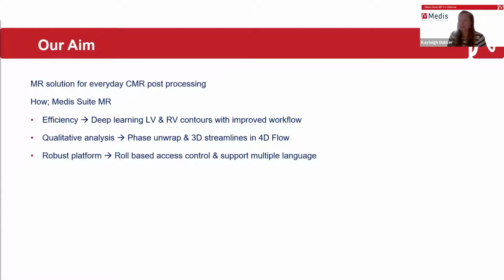And then at last, maybe a bit more IT based, but also very important for your platform, is that we have added role-based access control. So the right people get access to the right parts in Medis Suite, for example, anonymization or removing data sets. And to make the application understandable for everybody, next to the English language, we have added 6 different languages, both in the software itself as well as in the user manual.